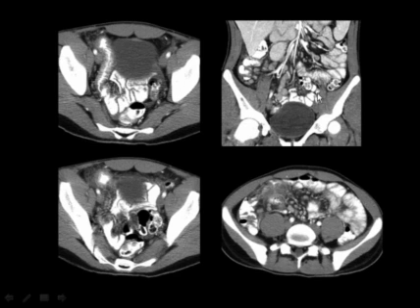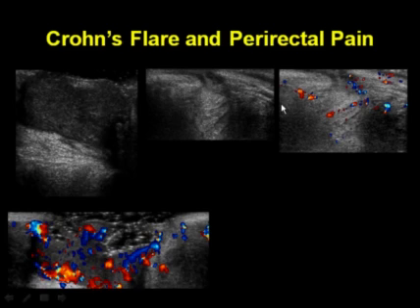Here we see this patient's CT scan, very abnormal appearance of the terminal ileum, which is markedly thickened and irregular. We see it here in transverse section with a lot of walled-off, inflamed mesenteric fat. And I also wanted to show you this image because you'll notice that the lymph nodes are also enlarged, and this is a so-called secondary mesenteric adenitis.